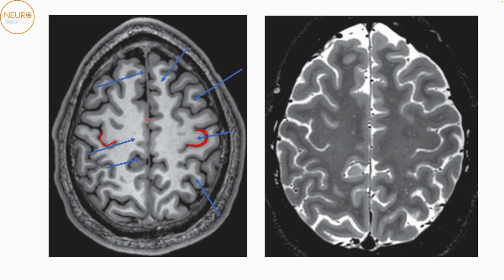This is the medial surface, the medial surface corresponding to the precentral and the postcentral gyrus. So this over here represents the paracentral lobule. And we know the paracentral lobule is going to end posteriorly on the interhemispheric surface in the marginal sulcus, which is the upturned end of the cingulate sulcus. That is identifiable over here.